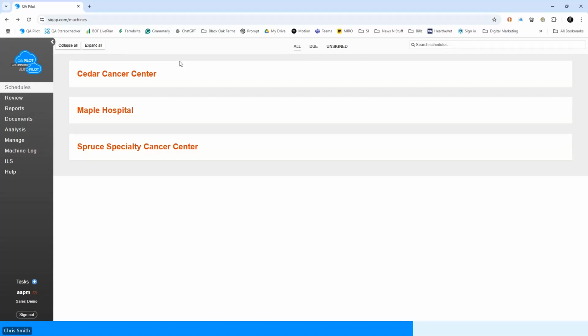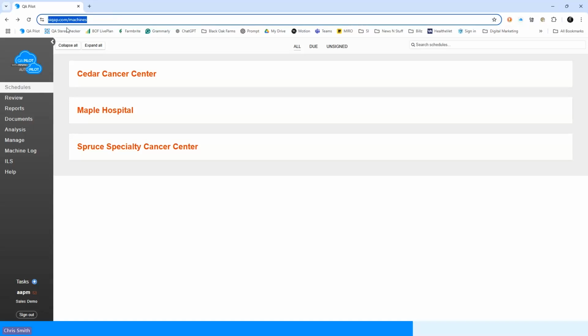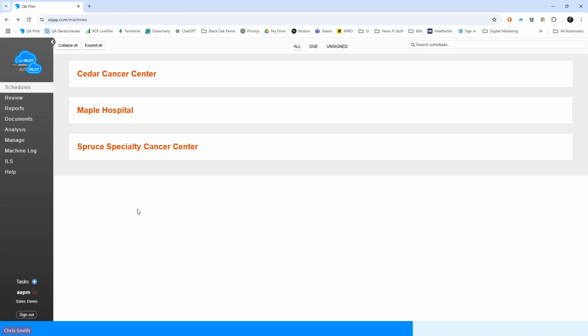Yep. Great, thank you. Okay, so this is the base entry point for the QA pilot platform. As you'll see, this is a web-based product, and we have a number of things that will show up for you as a user on the screen. There are a couple of things to take into account here.